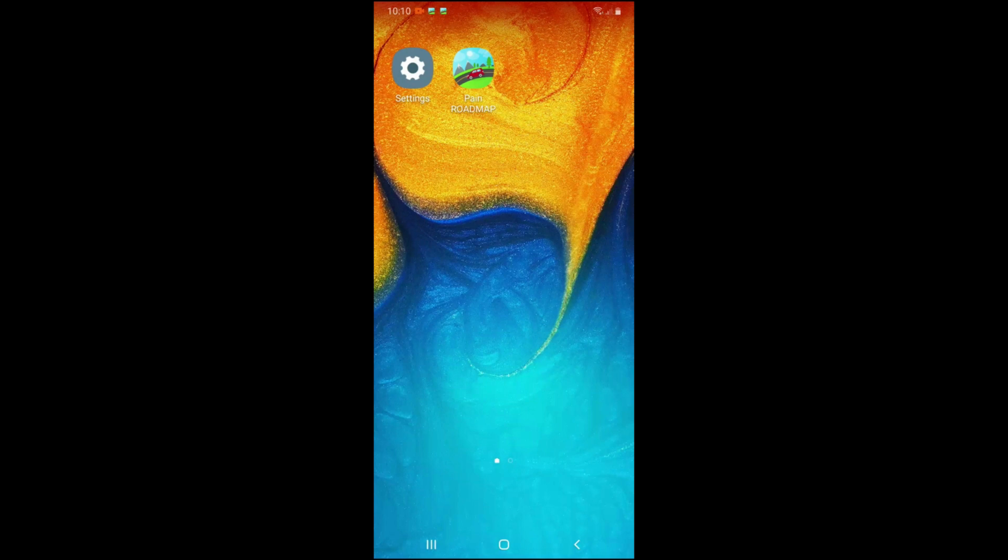This is a video demonstration of the Pain Roadmap app. On this home screen here we have installed the Pain Roadmap app and also settings, if you need to change any of the settings. I'm first going to go through entering pain scores.